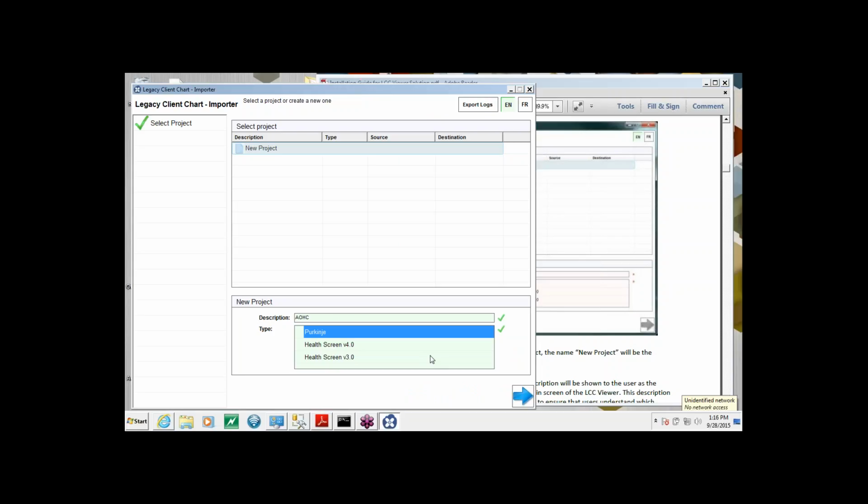That is the user-friendly name that we want there, because this name will be available to the end user. When you're single site, it doesn't matter as much, but when you're multi-site, that's the name that the providers are going to see in the tool to select the site they want to access. So you want a friendly name, so users understand which site they are connecting to when they select one of the two sites.